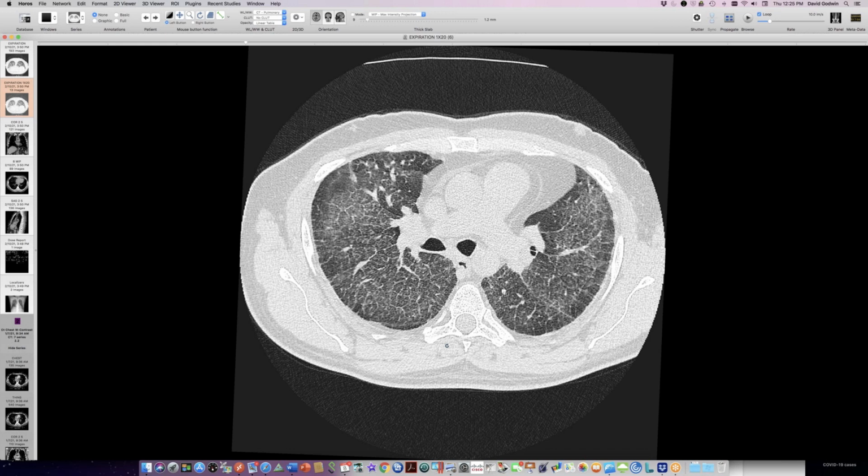He has no pulmonary hypertension or anything like that. His PA is completely normal in size. His right heart's normal in size. They said that his echo was normal. No, they said his echo's normal. This pulmonary artery is biggish here. This PA is a bit big.